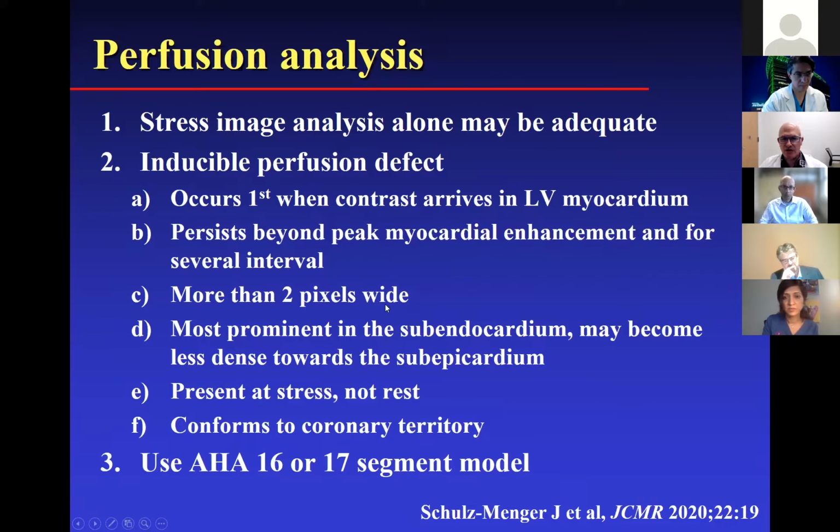It is generally more than 2 pixels wide. If you see a defect that's only 1 pixel wide, you need to be concerned that that's a dark rim artifact, which I'll mention more on a subsequent slide.